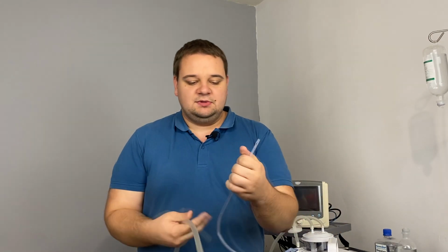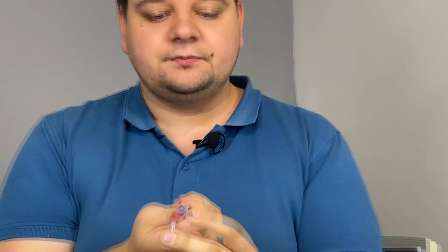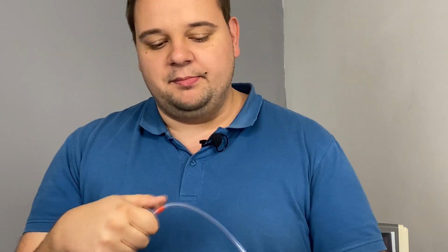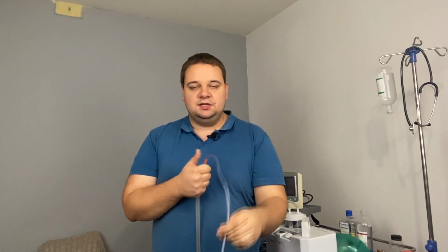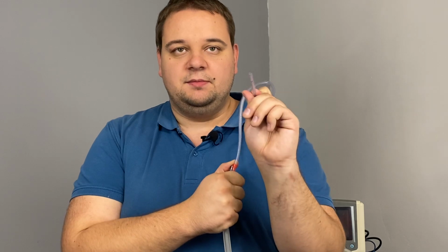So this is the proximal part. We attach that to the tube, and you see that nothing happens. That's because it has a spare entryway for the air. This is for our manual control, so we don't pump every time. So the compressor is on, the device is working. Now I get my tube inside something that I need to clean, and then as soon as I'm at my destination, I just use my finger to close this entryway, and now it starts pumping from the lower part.